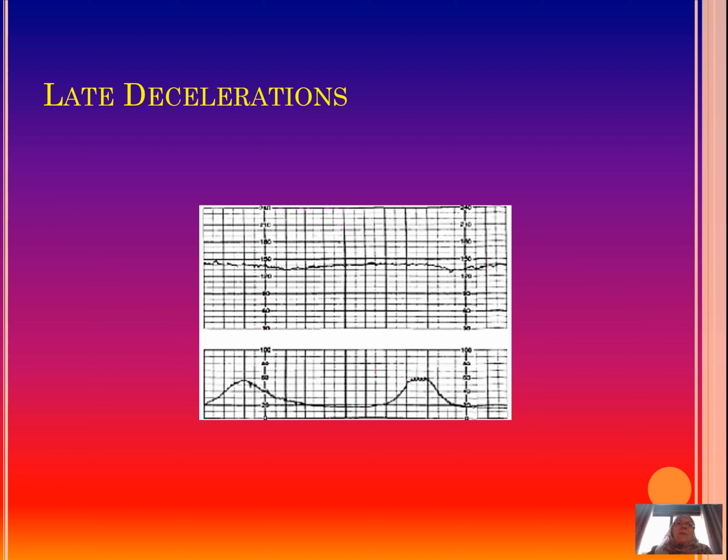I'm sorry, but you can just see a slight going down of the CTG. Just to put the CTG into context, on the whole this is a very worrying CTG. It not only shows late deceleration, the variability is also reduced, and this is a CTG of quite a compromised baby.